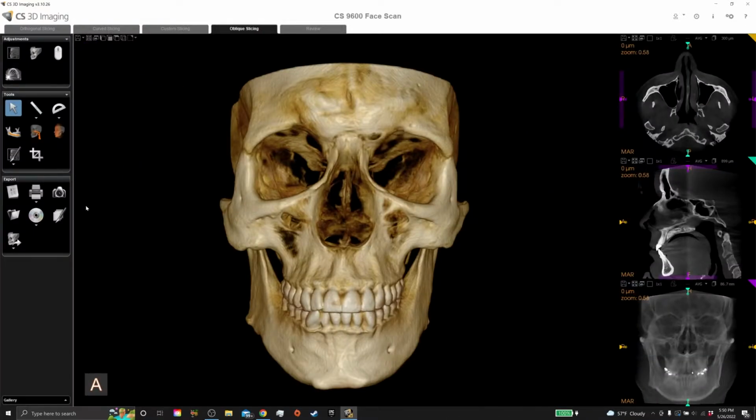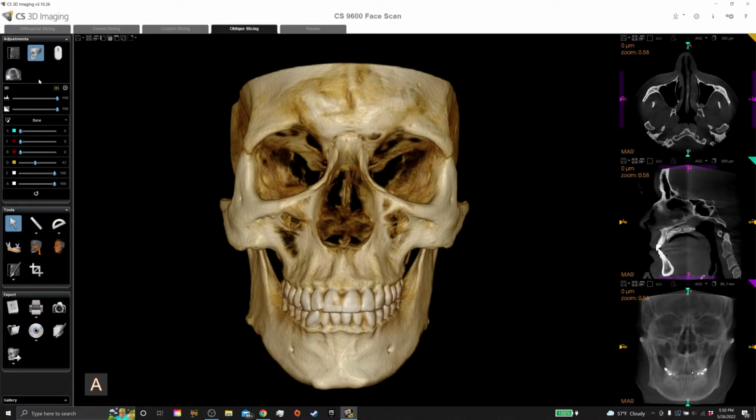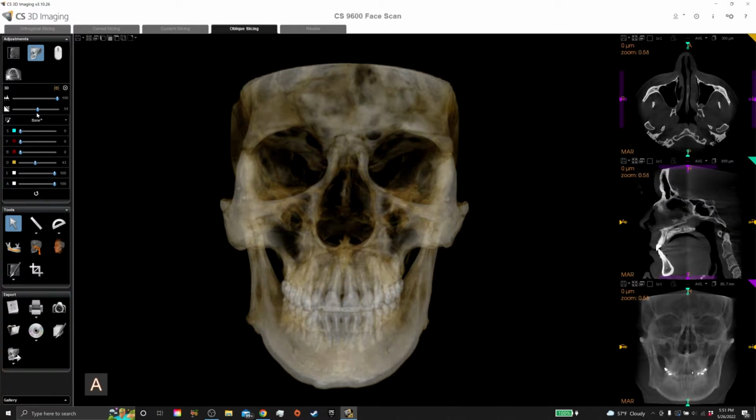In the 3D reconstruction, we're already getting a great view of the bone, but we can improve on this and create some visuals that will help set yourself apart from others. In the 3D adjustments tools, we can make adjustments to opacity to better see the roots. We can also change the values with specific densities, which generally correlate to different kinds of tissue and bone. Here we have skin, flesh, bone, dentin, enamel, and amalgam. You can change these values to see different things, or highlight certain areas.